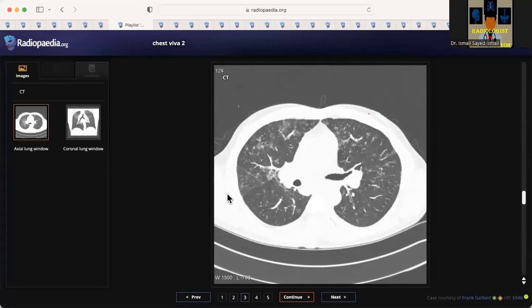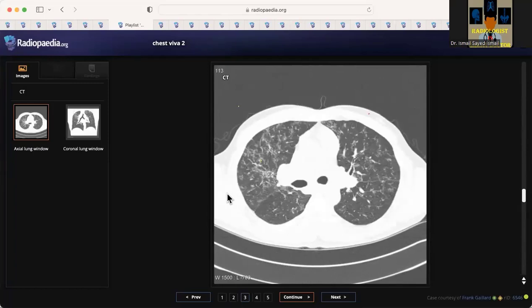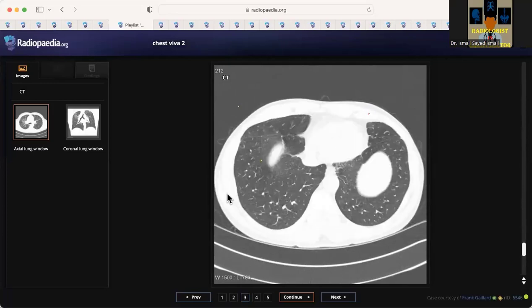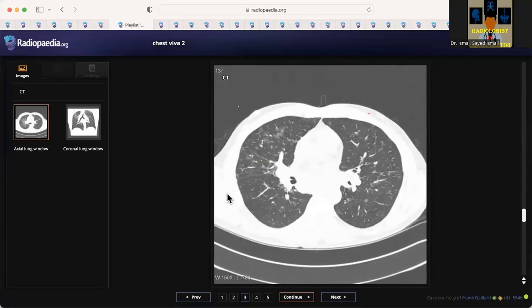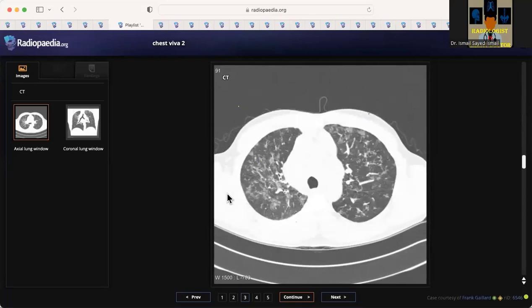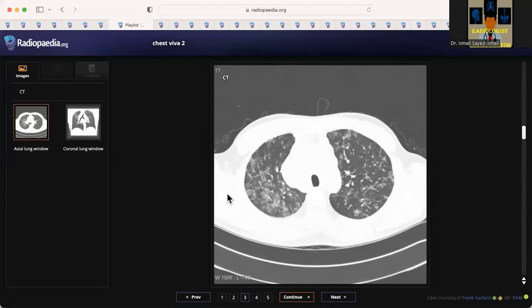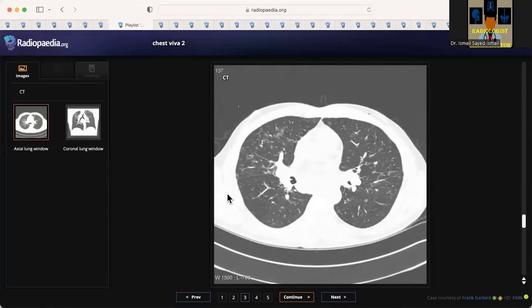And the interface between the lung parenchyma and the bronchovascular bundle, I think it is appearing a bit irregular. And this conglomerate of nodules is giving rise to, can I see the upper zones again? I mean, it looks like a bit of galaxy sign as well. The mediastinal contour is lobulated, confirming the diagnosis of lymphadenopathy.